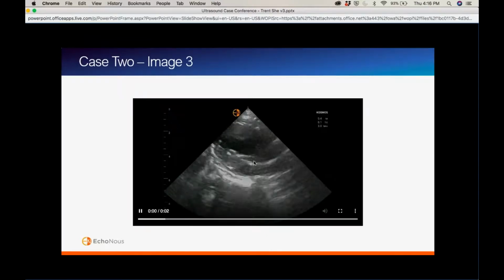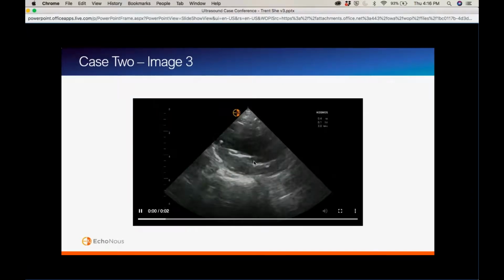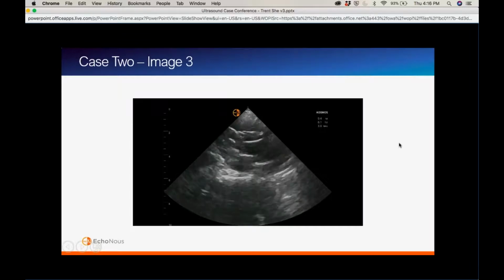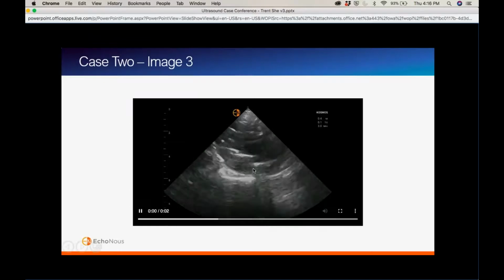Eventually, same thing for this patient, we rushed her to get a CTA because we were concerned that we had a AAA that was ruptured or leaking, and it turns out those hyperechoic areas were from a previous operation. She has an endograft, and those really bright objects, now that I look back on it, they don't quite look like calcifications. They look like the tips of the Gore-Tex that's used in the endograft.